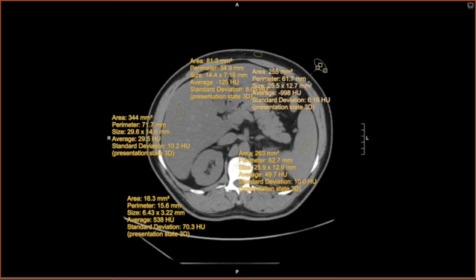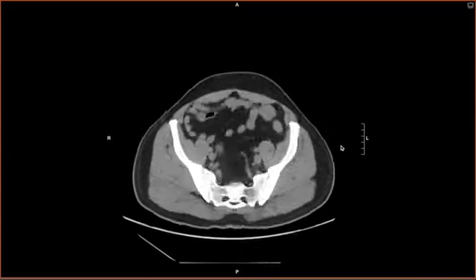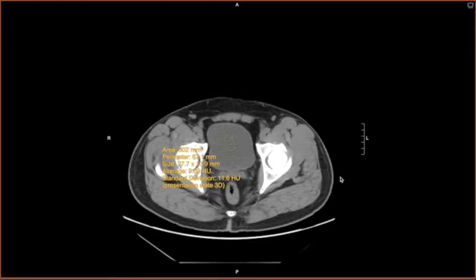Okay, moving up to the higher density structures, we have the subcutaneous fat, which is shown as very dark tissue right here. The average here is -125. Our ballpark number was -100. Moving on, we can move down towards the bladder, where it should mainly be urine or close to water, and we have a lower density, about 9 or 10.